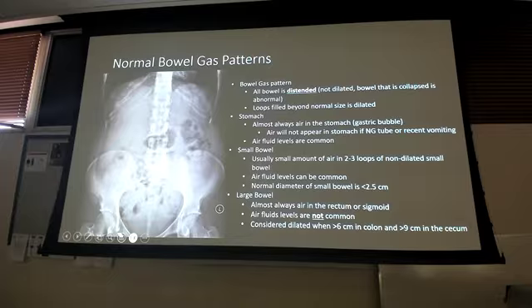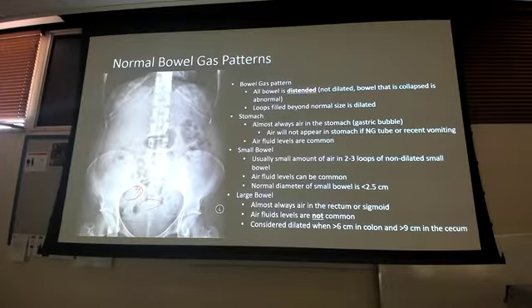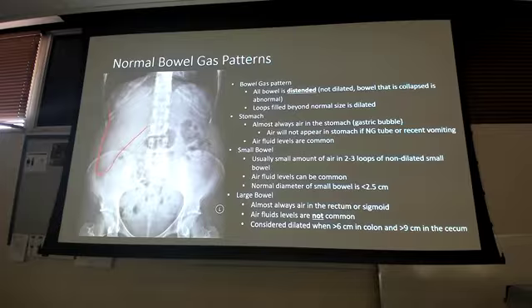Does anybody notice any foreign bodies? See the surgical clips? Some surgical clips there. And then if I trace my liver down, whoa. Probably hepatomegaly, right? We haven't seen a whole lot when the liver has gone down into the iliac crest. We haven't seen a whole lot of liver yet at all. We'll see some other ones. But again, tracing that soft tissue line of that liver that comes down into the iliac crest.